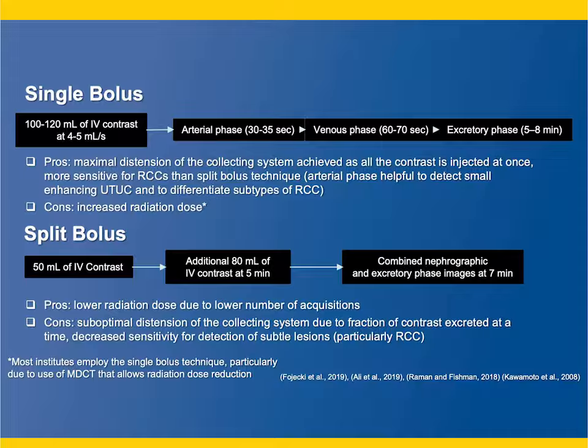That works out very, very nicely. You can see the split bolus technique. You can do split bolus, but again, one of the challenges is every article on split bolus always said they're not really sure how accurate it is, and I just really have never used it, and I think our protocol works the best.